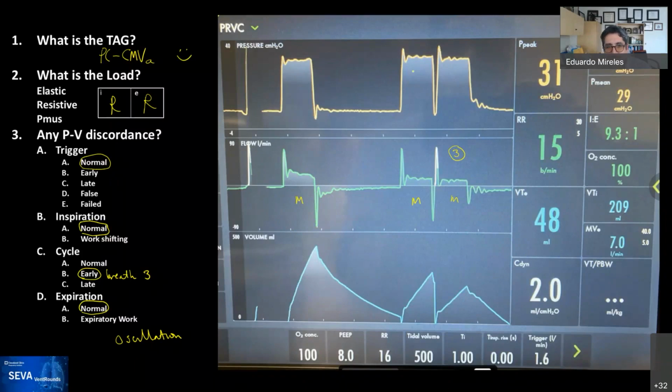So what I would interpret of this, rather than inspiratory effort from the patient or other, is that the machine is pressurizing to achieve the inspiratory pressure and overshoots, and when it overshoots, it tries to drop the pressure down, and then up and down, and so you see those oscillations, and you will see exactly the same here.